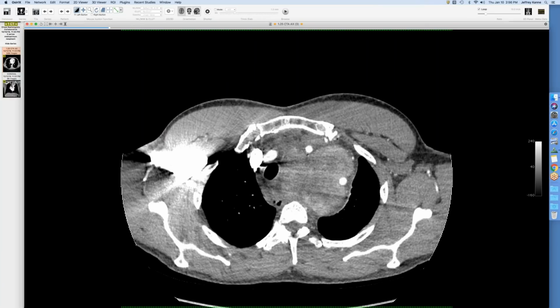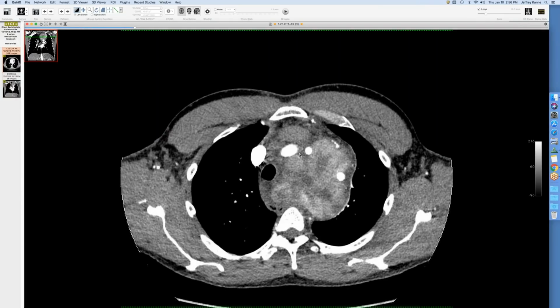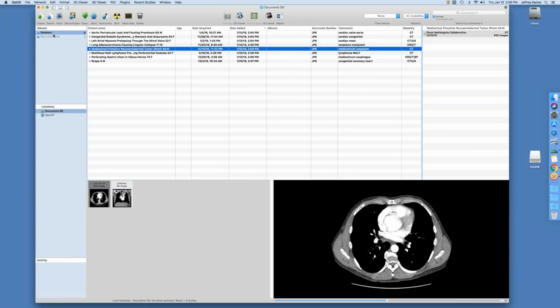Well, I don't know, because it seems to be a plane right here. You can see it, you may be right. The vessels seem to indent on it, but you can see there looks like there's a little tissue plane with the left common carotid and even the brachiocephalic. So it may have a capsule around it, but with all these feeders, it may be kind of a mess. So I don't know the definitive plan.